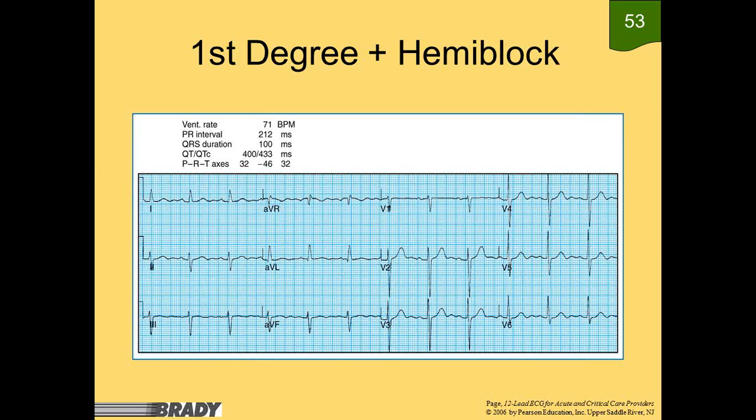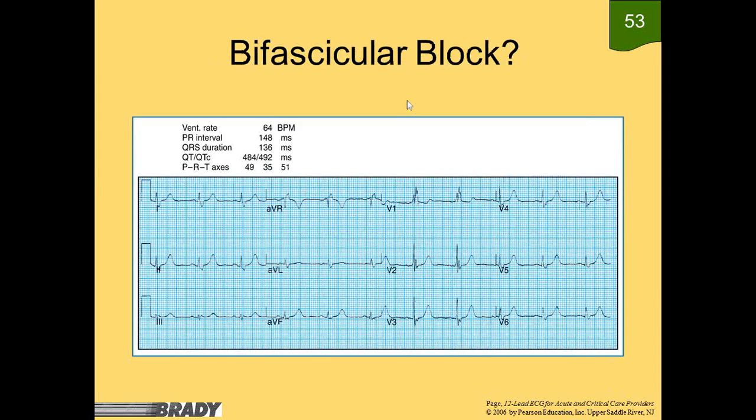So we've got a first degree block, just barely, and a hemiblock. So this patient, although the first degree is what you're seeing, with that hemiblock, that makes it pretty significant.